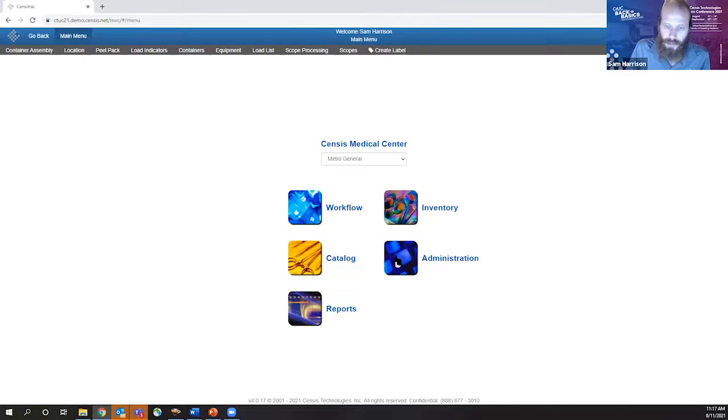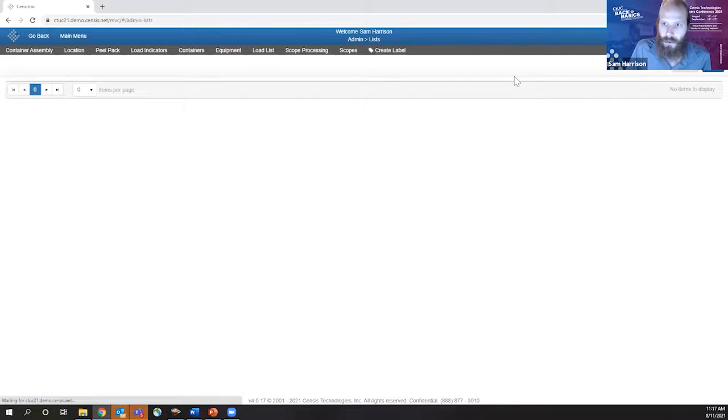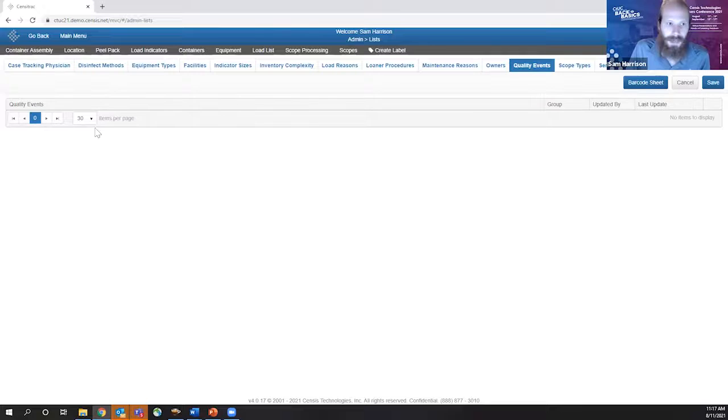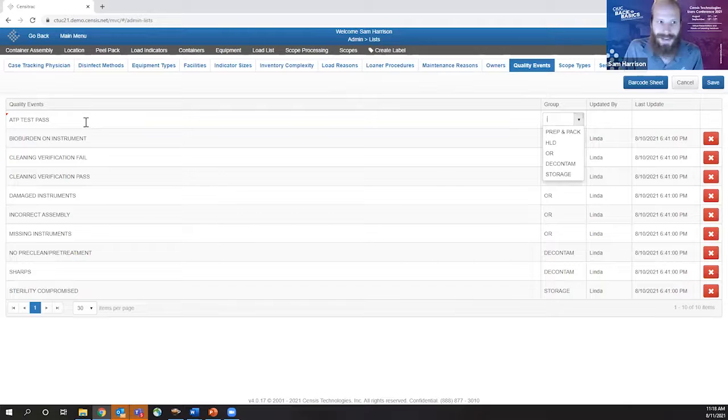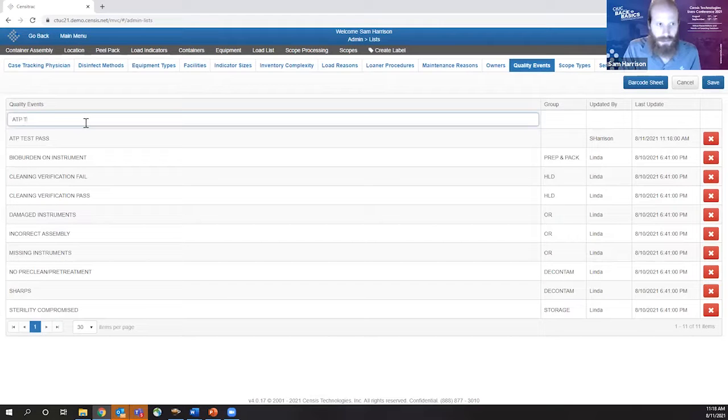So to do it, I'm just going to go to admin lists. I'm going to go to quality events. I'm going to add ATP test pass. I'm going to save that. I'm also going to add ATP test fail. I'm going to save that.